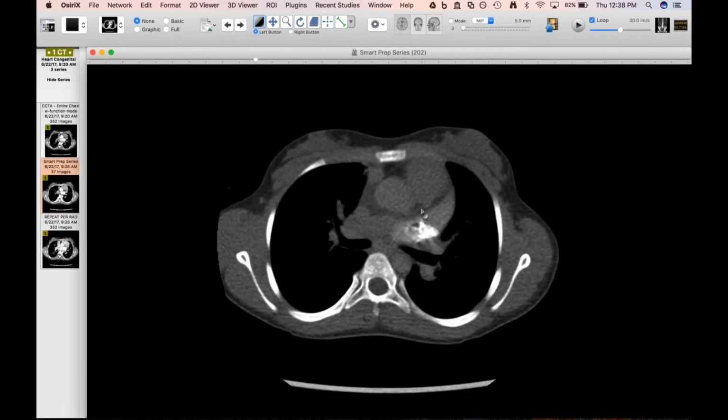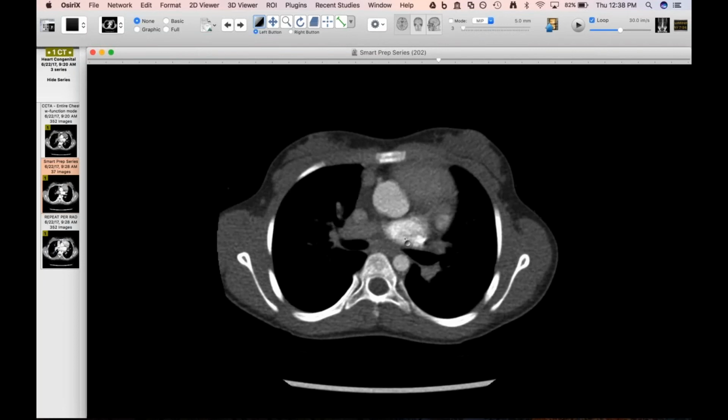And then we see the left atrium, the aorta gets contrast, still nothing here, and then eventually we'll see the blood recirculates and we have contrast in the SVC. Now, I've shown a case almost identical to this in a woman who was in her, I don't know, 40s or 50s, who had had an ASD repair, a secundum ASD at that time, and didn't get any better in terms of her symptoms. And it was the exact same explanation.